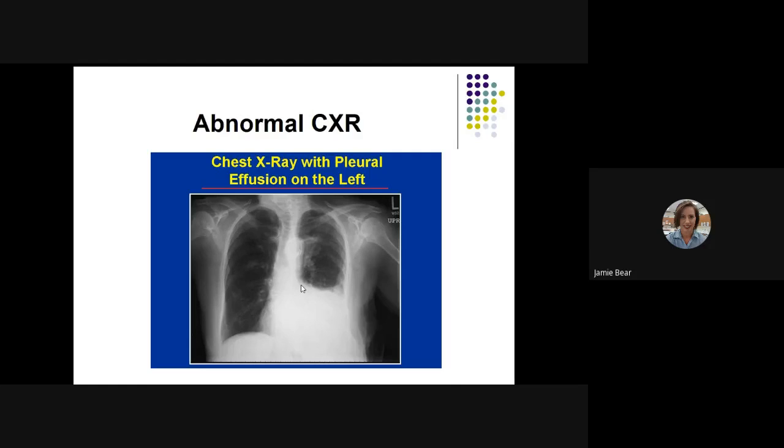So we would assume this patient would have a pleural effusion if all of this down here, so the pleural effusions, it's extra fluid, so they have a gravitational pull to the bottom, and you can see this meniscus sign, and so you have a good indication that this is water. So there's a couple of things you could do. If you would do what's called a lateral decubitus, that means you would lay a patient on their side, you would see all of the fluid shift to the bottom. I'm sorry, you would see all of this side blunted with fluid.